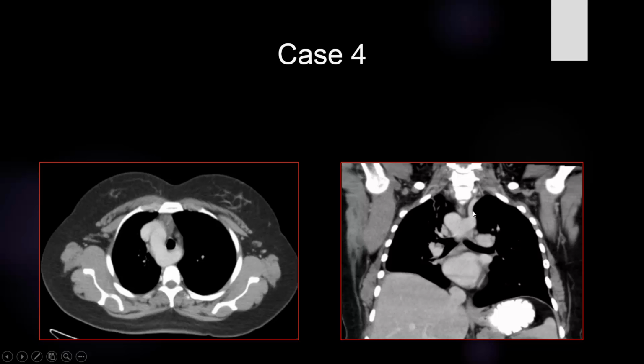This artery, as we see, this is the aberrant left subclavian here, is showing a dilatation of its origin, which is called Kommerell diverticulum. So this is a case of a right-sided aortic arch associated with aberrant left subclavian artery showing a diverticulum of Kommerell.